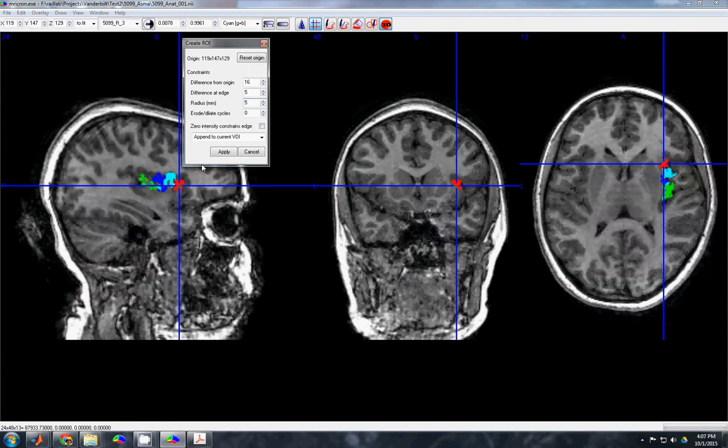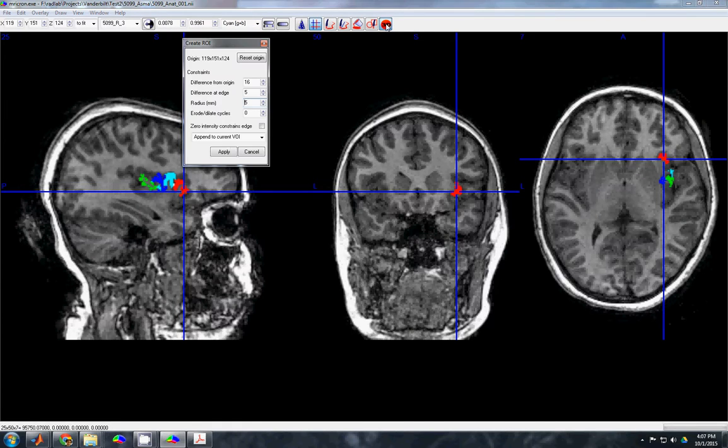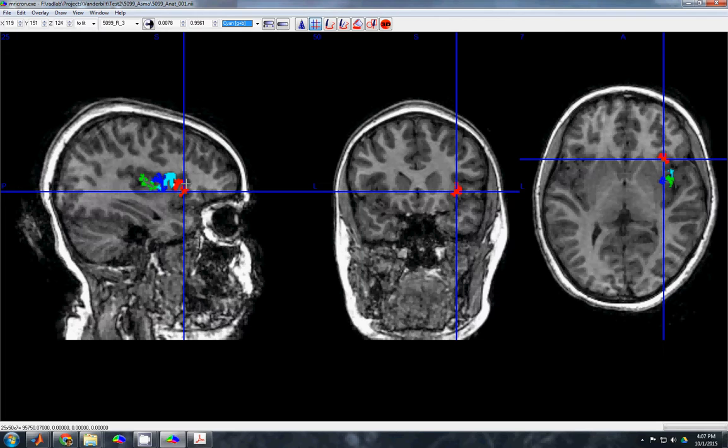Start inflating here. Looks good. Follow it around the bend a bit, so I can really capture that. Looks good. I'm kind of missing this bit in here.